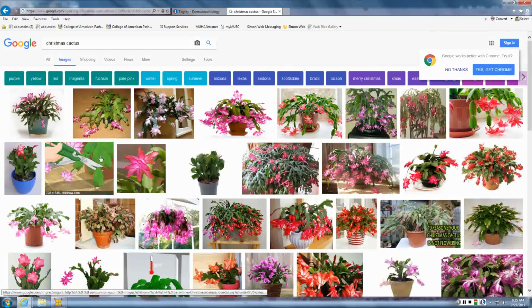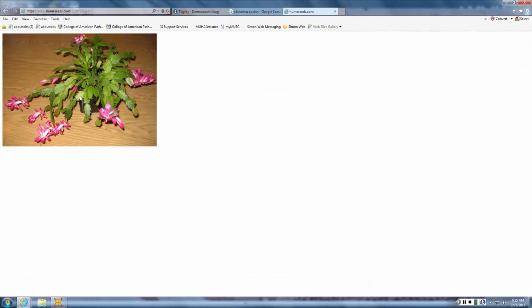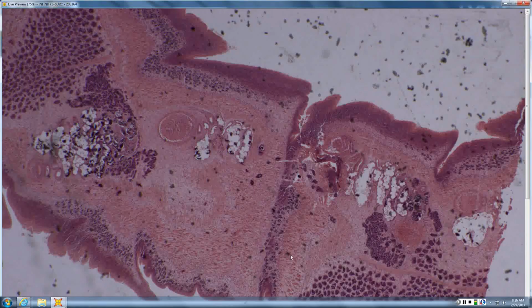Here we go. Let's go a little higher. See how the leaves form those segments that fit together. That's exactly what the tapeworm looks like. And you see the constrictions there where it forms those individual segments. Each of those, they're friable and they break off, and then each of those can germinate into another.